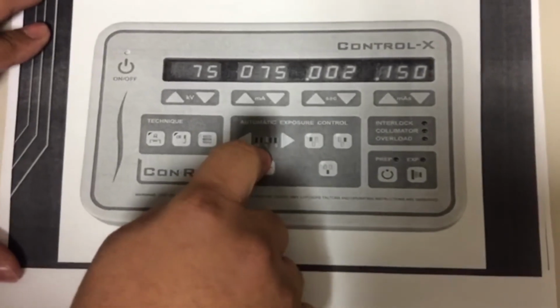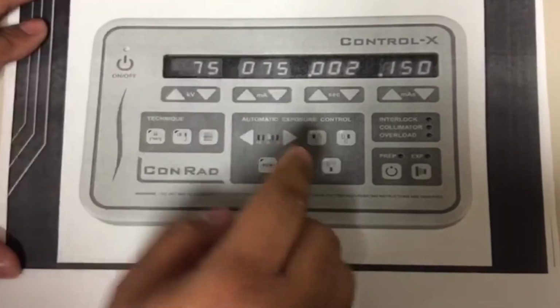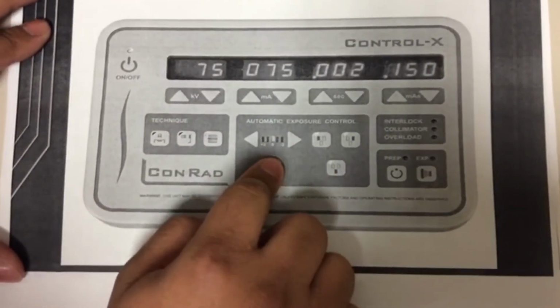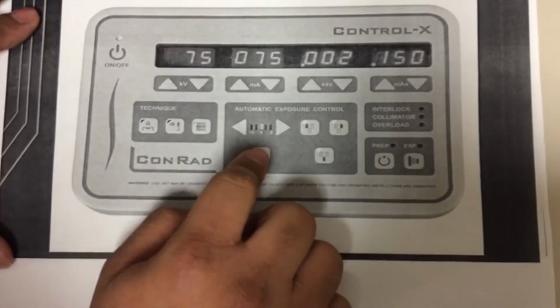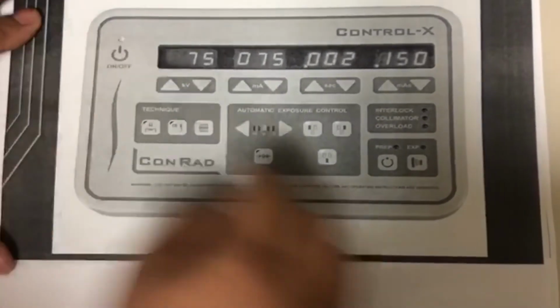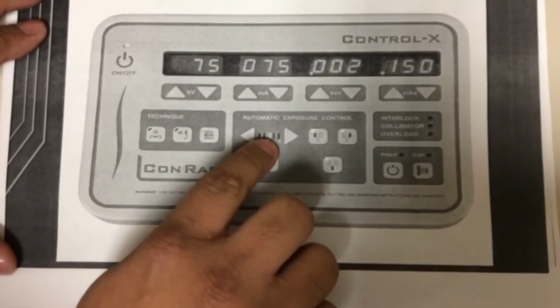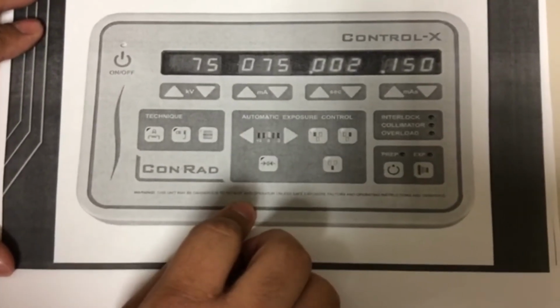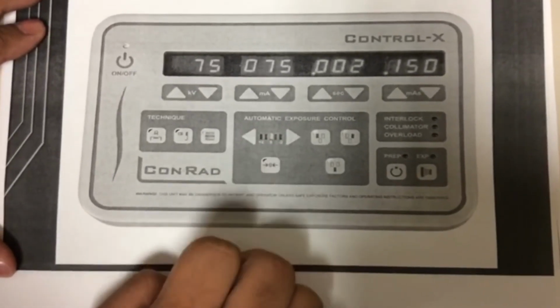This basically tells the machine, for example, if you're doing a chest lateral and you see that patient's a little bit bigger, you're probably getting a little bit more technique. If not, you're going to get an underexposed image due to the fact that you have to go through basically the whole patient side to side. So you can just increase this 1, you get 25% more, and you'll get a nice even exposure throughout the image.